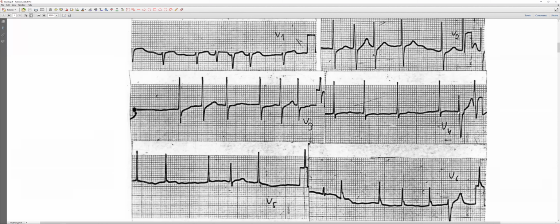How would you say that beat could come from the ventricle? What kind of ventricular beat is this? This is a premature ventricular beat. But you cannot state premature. Why? What is the criterion for premature? Being a premature beat, it should come earlier. Earlier, yes. And if you have an absolute arrhythmia, what is a normal RR interval? You don't know, yes.